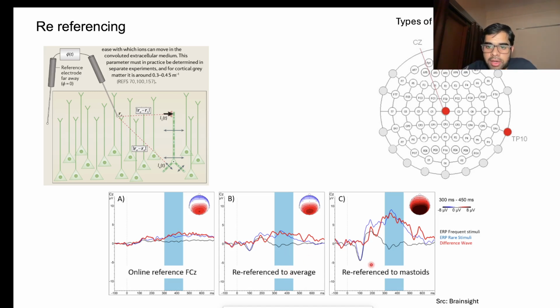So this difference comes up, but you also see other things happening here. I didn't mention it before, but this is an auditory oddball task, where they see frequent versus rare stimuli, and whenever a rare stimulus occurs, they identify it.